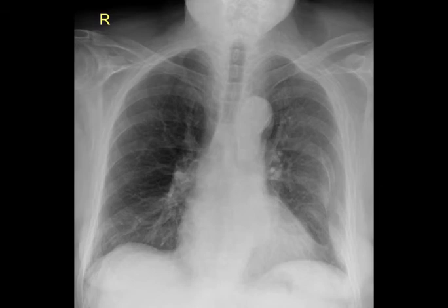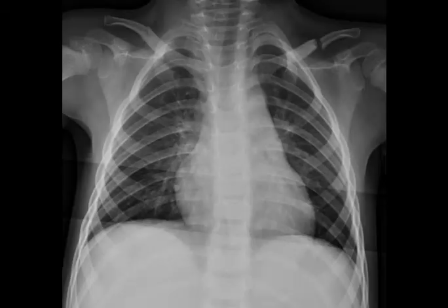Next, we'll do the same thing and trace the lateral and anterior ribs. I recommend approaching one entire side at a time rather than breaking it up and looking at both sides all the way across. This allows your eyes to adjust and switches your areas of focus. Now let's move up to evaluate the clavicles and shoulders, being able to trace around the cortex of the bones.